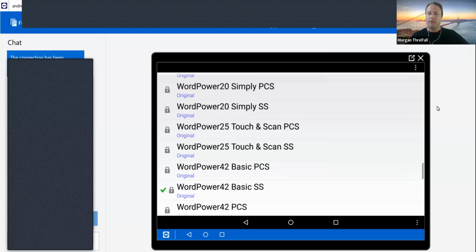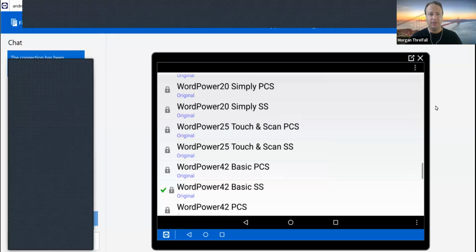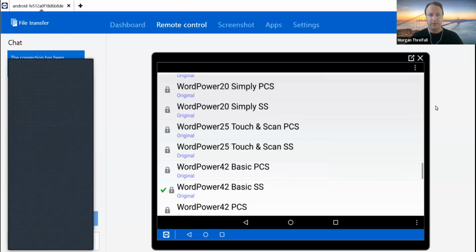All right. Well, I'm using a software here called TeamViewer, and TeamViewer will be on all of our devices that we trial and that you purchase from us. And it's a software that you can use from your laptop to log into the communication device. And it will come up on your screen exactly how it appears on the device. And you can go into the vocabulary, change the settings, help your students to use their device. So I highly recommend using TeamViewer. It's fantastic software.